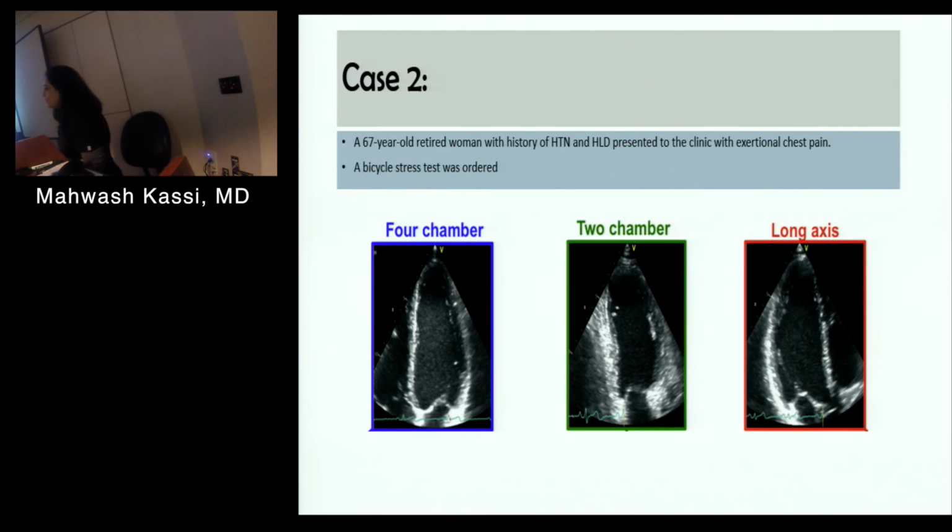Bashar, which one? 4-chamber view. Which walls do you see? You see the inferoseptal, the basal and apex, and the anterolateral. Okay, that's 4-chamber. What's 2-chamber? Would be anterior and inferior. Good. And what's along in the 3-chamber view? Anteroseptal and inferolateral. The anteroseptal and inferolateral.